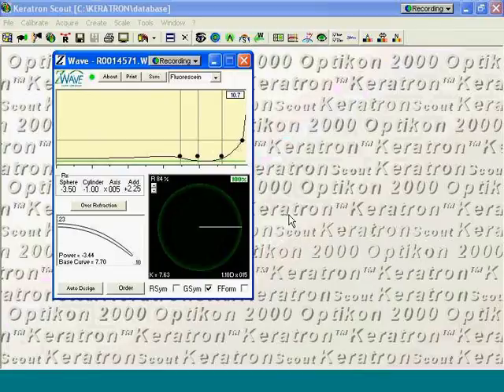I'd like to discuss the display format of the design control points within the ZWave work screen. There are basically 4 control points for the design of the back surface of the contact lens. If you hover with the mouse over each control point, you'll get a readout that shows what the control point designates. This is the back surface optic zone, and it has a chord diameter of 7 millimeters. The lift is about 3.4 microns away from the cornea.